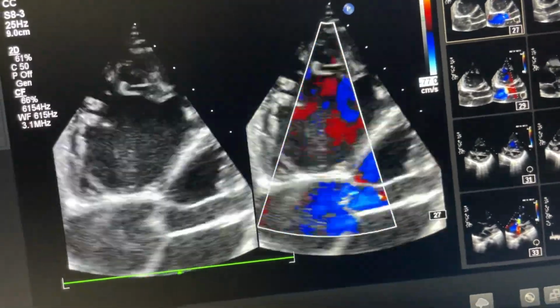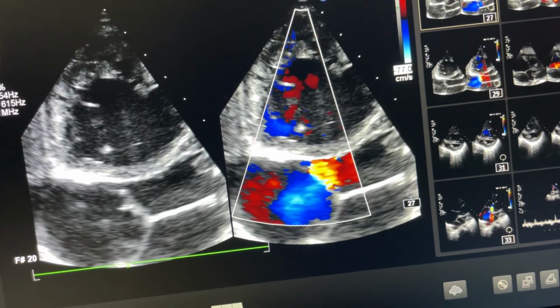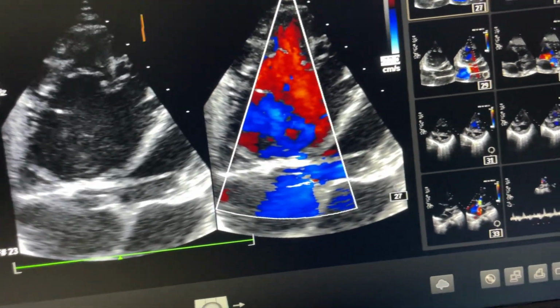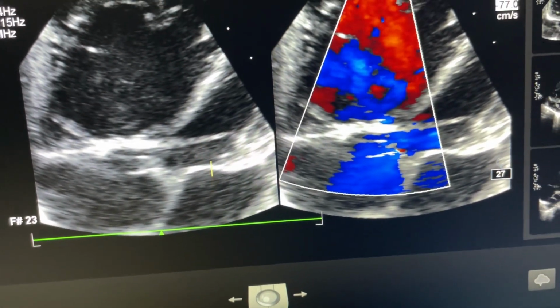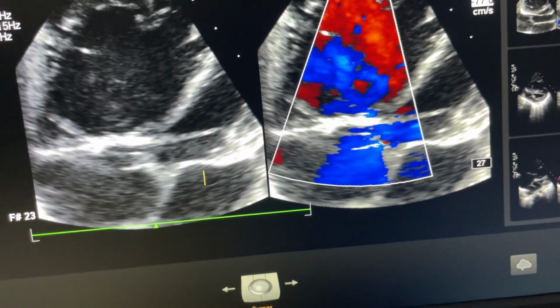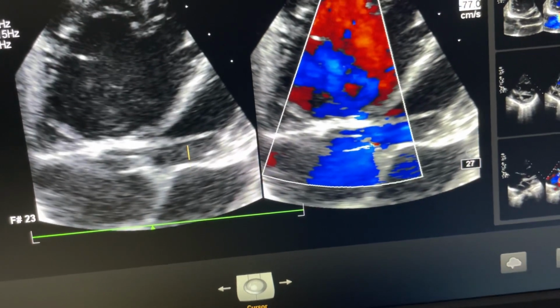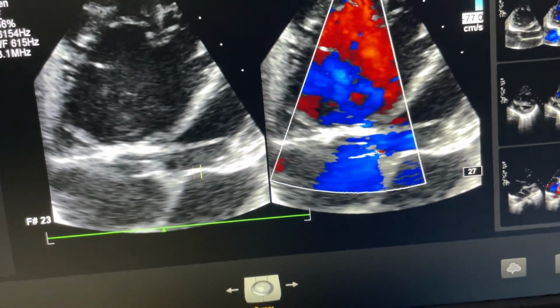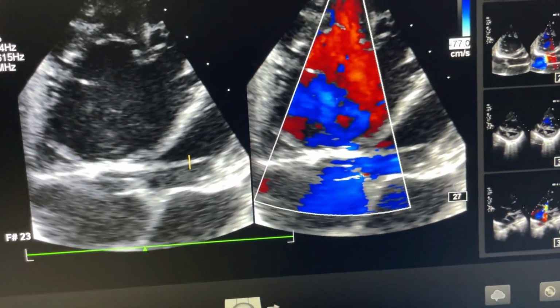You see this proximal part is dilated compared to distal part. This is proximal part, because in the flow dynamics this part receives blood first, then this blood goes into this part. So this is proximal part, and this is distal part. So this is proximal chamber, this is distal chamber of left atrium. Thank you.